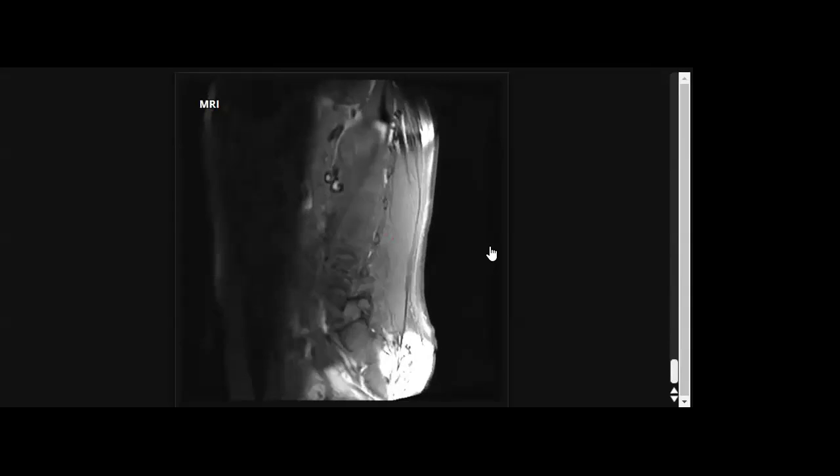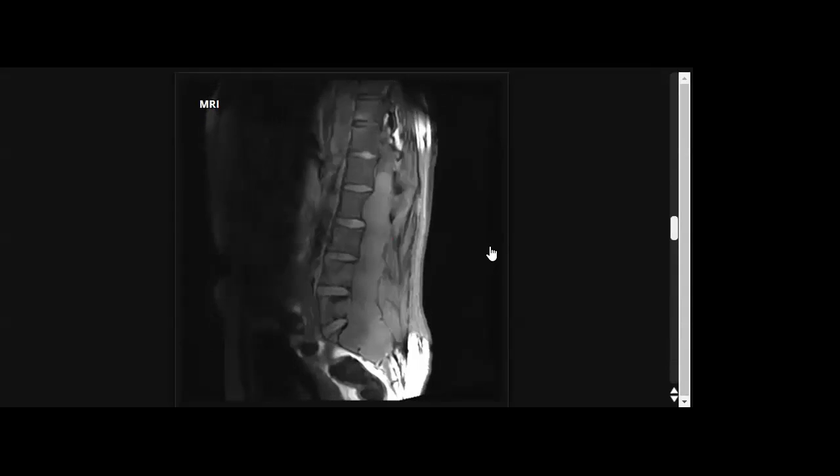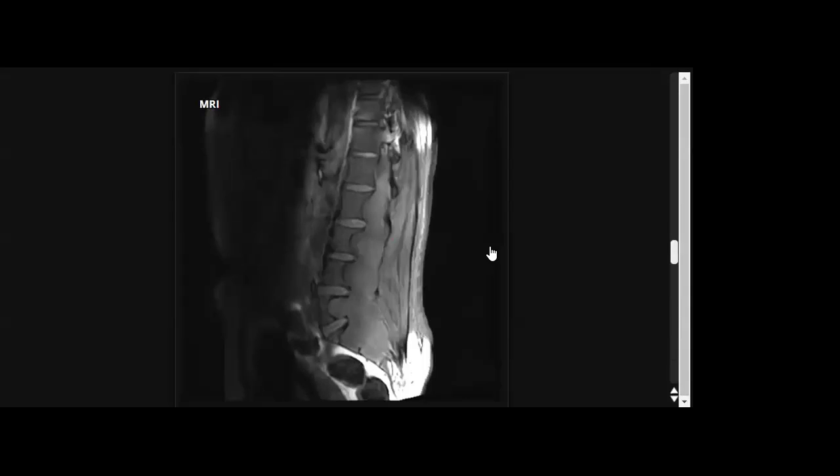You mentioned two main differential diagnoses: dural ectasia of neurofibromatosis and mass lesion. Can you suggest one possibility over the other from this sequence? Well, it shows CSF signal in the dural sac, so I'm favoring dural ectasia due to neurofibromatosis or Marfan syndrome. I'll give you the contrast.